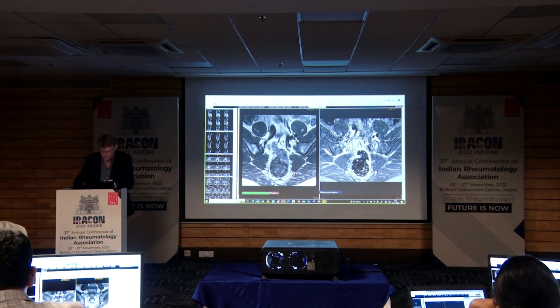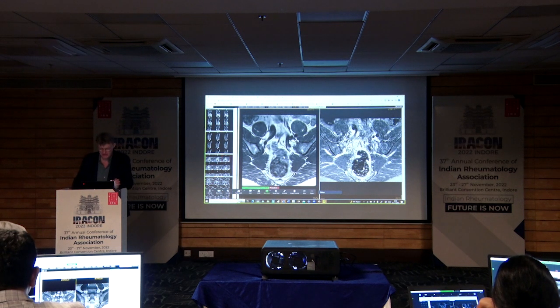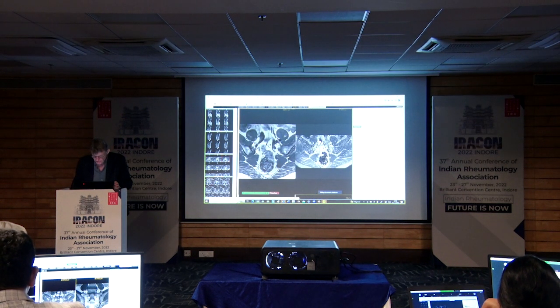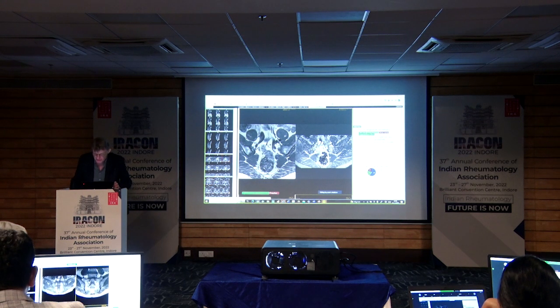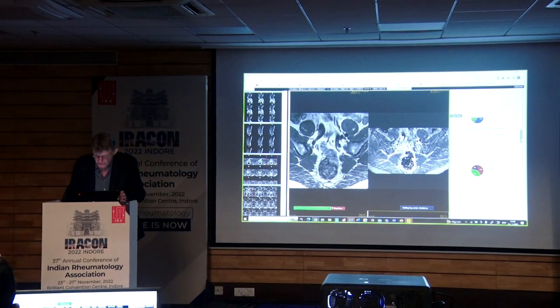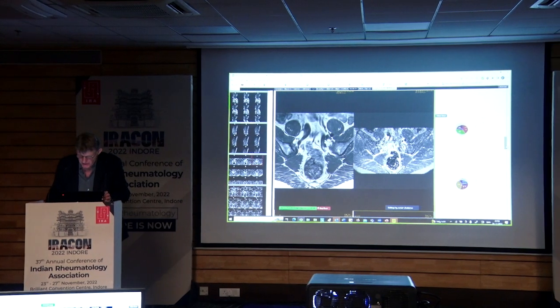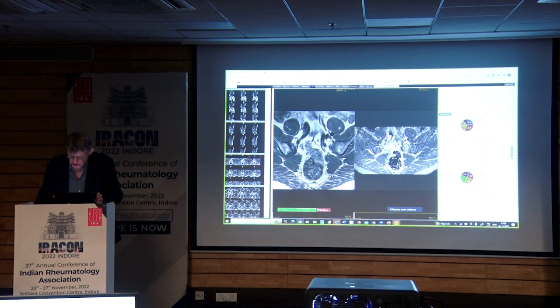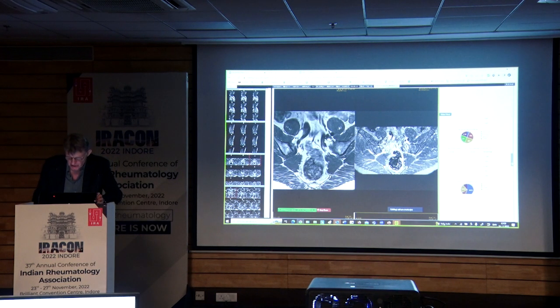If you look at Zoom, and hopefully that's still on, I will see if some of you have answered anything. There's 5, that's not too many, but that's fine. So most of you said bone marrow edema, you can see in STIR. And regarding T1, you said fat infiltration and erosion mainly. And then bone marrow edema is located at all the different locations, more or less. Fat metaplasia is in all locations, 4 out of 5 say it. Bone erosions are mainly in the right ilium, but also a little bit elsewhere mentioned, but you agree on the right ilium.